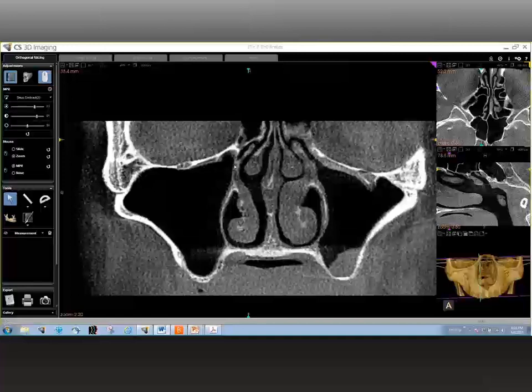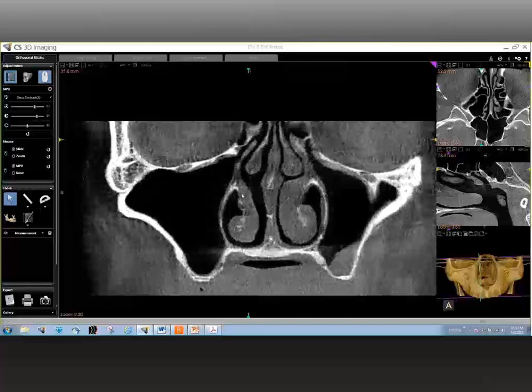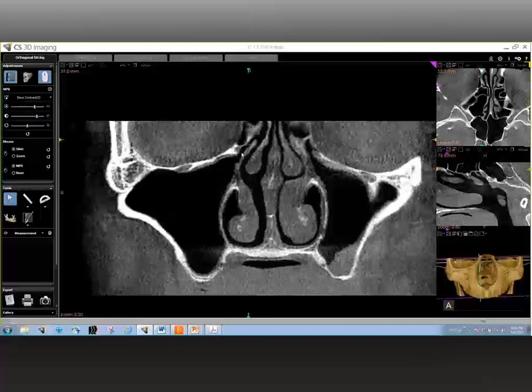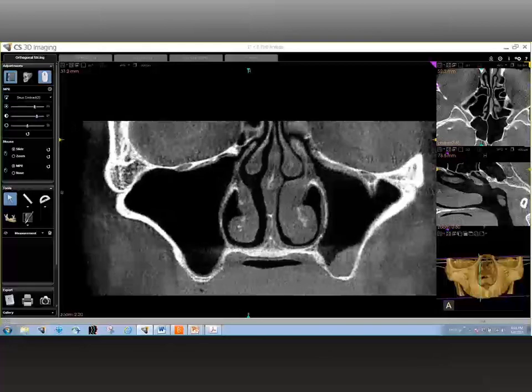And then you have the medial wall of the sinus. Now, the medial wall of the sinus does not seem to be continuous because it is actually a very paper-thin wall, and some parts of it may not be captured while scanning. But those are the most important anatomical structures that you see. Now, besides that, if you look carefully, it also demonstrates a very important structure that is called the ostium. The ostium can be bilaterally visualized right in that area, and you can see it extending all the way from the sinus into the nasal cavity. Now, keep in mind, the nasal cavity also can be visualized in the maxillary sinus, so it might be of importance to keep an eye on any kind of disease that could happen within the nasal cavity.